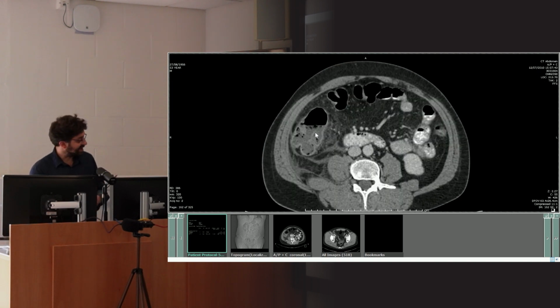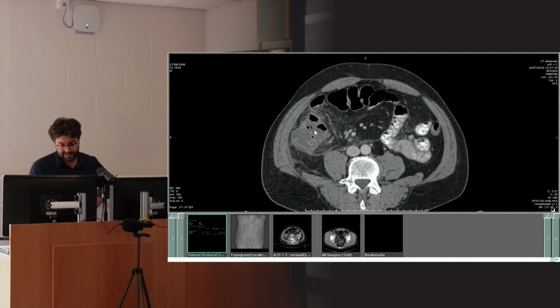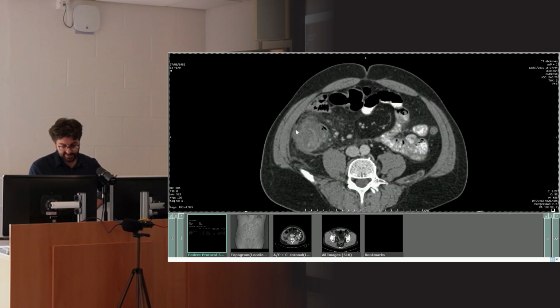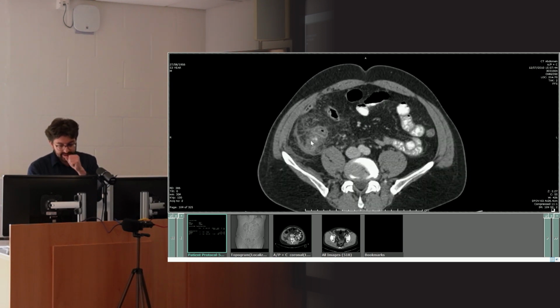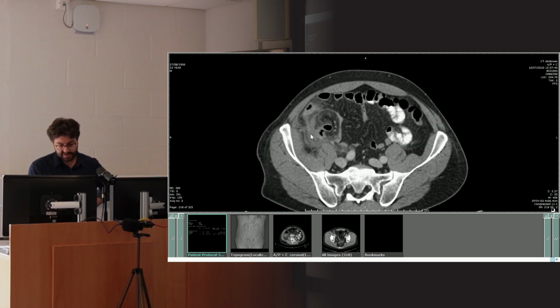You're beginning to get excited now because you're like, okay, I've got the ileocecal valve. Next is going to be the appendix. Appendix usually comes out a couple of centimeters below where the ileocecal valve comes out. So you follow the cecum, which by this point is very thickened with lots of fat surrounding it. And you're going down and you're looking to see if you can see a tubular blind ending structure.